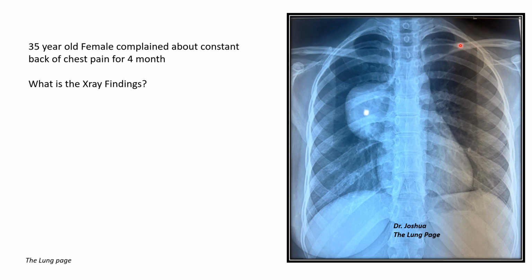When you see our order, A, airways completely normal. B, bones, you see all are normal. Cardiac contour normal. Diaphragms normal, no effusion. Right, when you see the lung field, here the lung field is normal, here also normal. But when you see this high area, right? So here this is a mass-like lesion, right? So we suspect there's a mass.